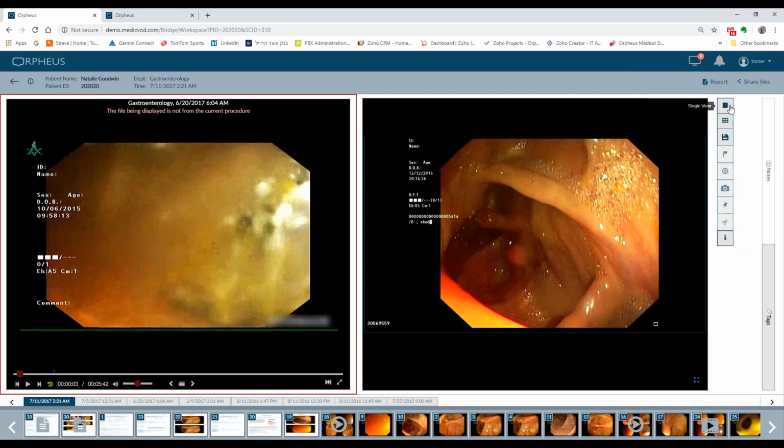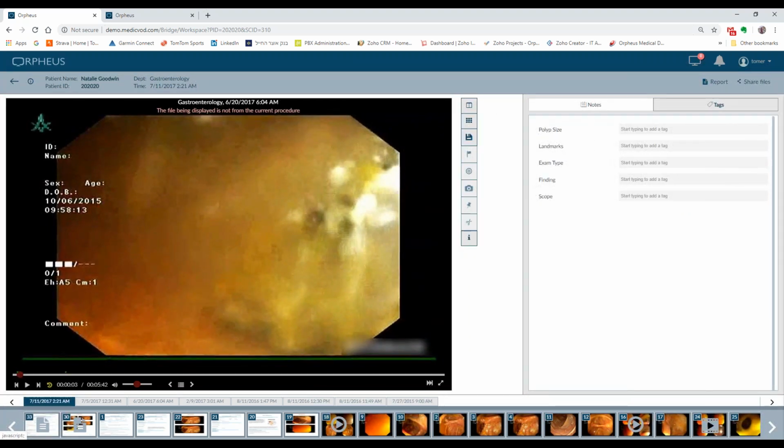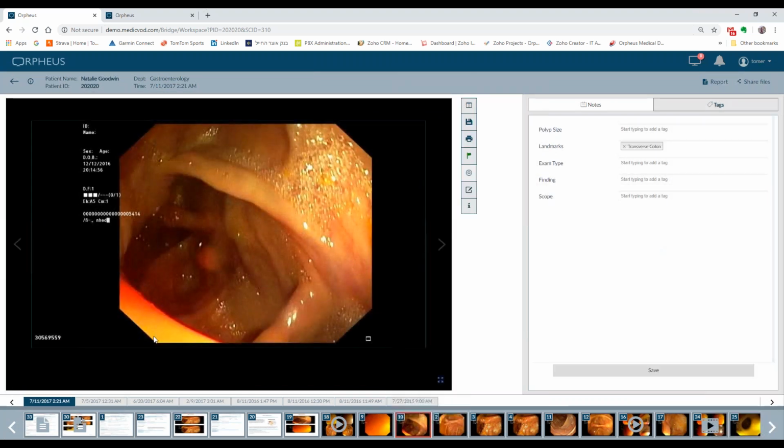That's pretty much, I think, what we wanted to cover here today, or especially on these two screens. Do you feel now a bit more comfortable with the Orpheus Web and able to explain also to physicians or clinicians what needs to be done or can be done?